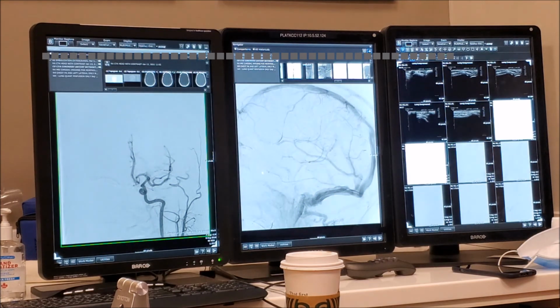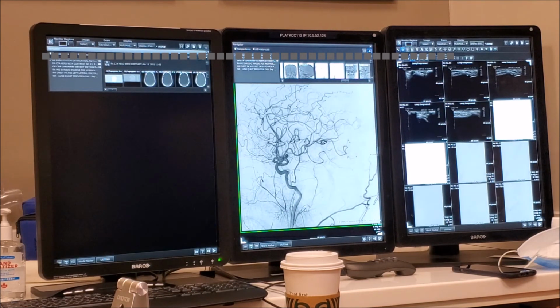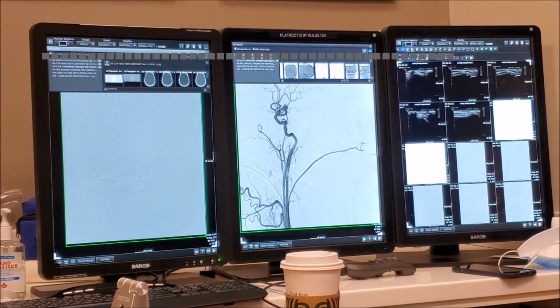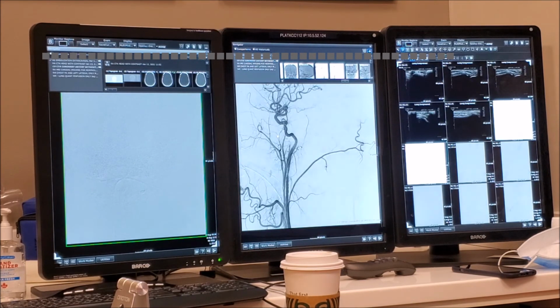Wow, this kid is a book. Sorry, let me just work it up in my mind. There's a small vessel. This could be venous, but that's why we couldn't find it on the other side. I used to know the bony foramina really well, CT really well, but I haven't done it in so many years.